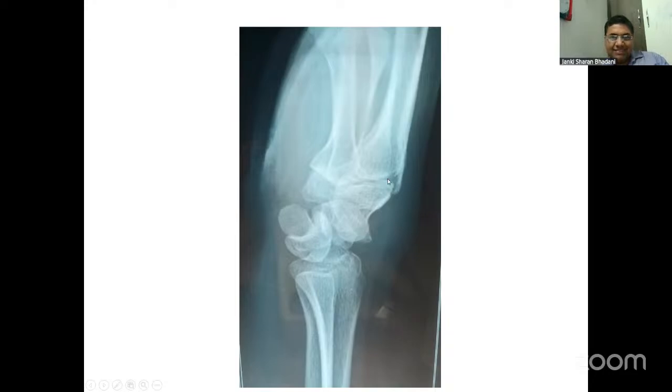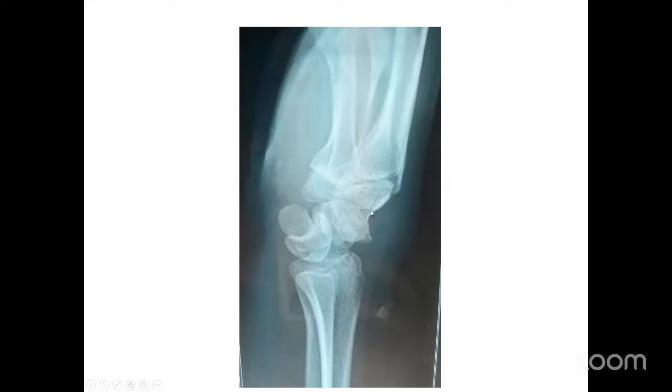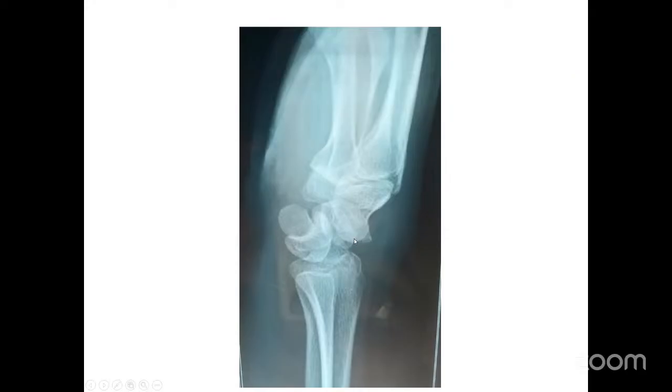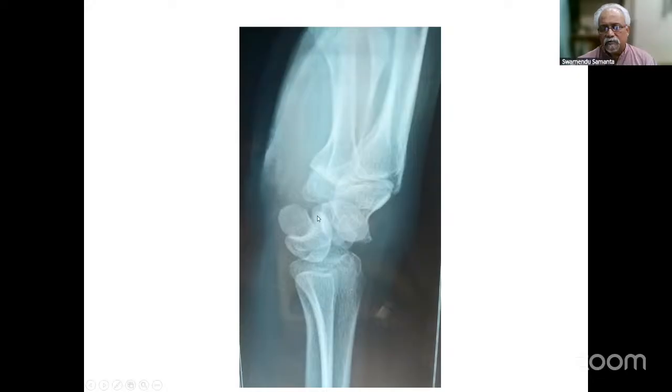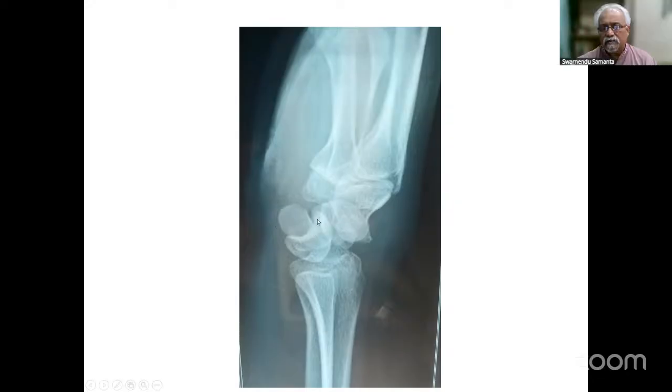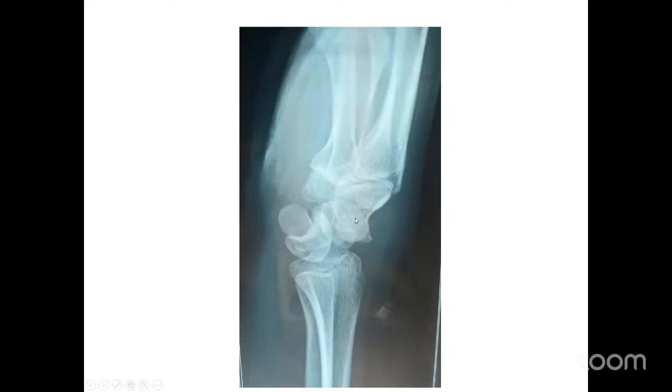You see that, I am giving you the hint. You can see the mouse. Yes, capitate. So where should the capitate be? Just below the inferior margin of that semilunar shape, aligned with it. The head of the capitate has to be here. Yes, sir. Okay. So what has jumped from the lunate?